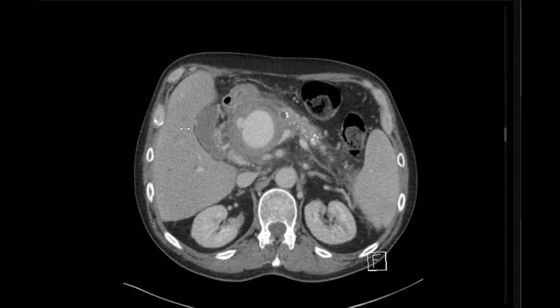Trace this one. Can I take the control? Yes, sir. Okay. Well done. Just leave it. Good, good, good. It's better assessed, of course, in the arterial phase. So I'll go to arterial.